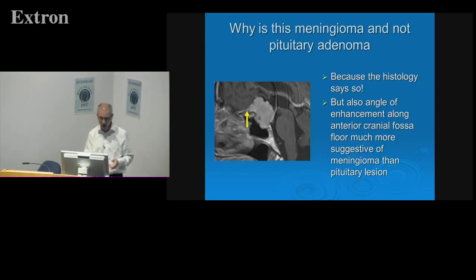And this is just a close-up to show you that obtuse angle that you get with extraaxial lesions. Where you get intra-axial lesions contacting the dural surface, it tends to be a more acute angle than that.